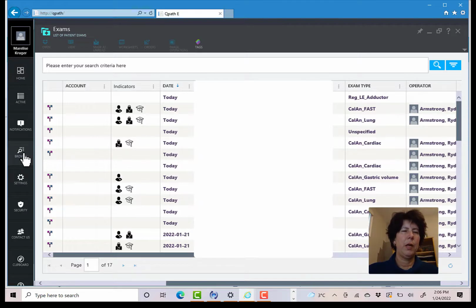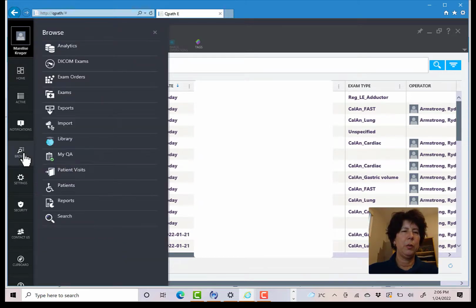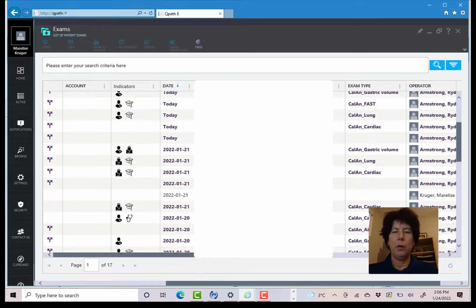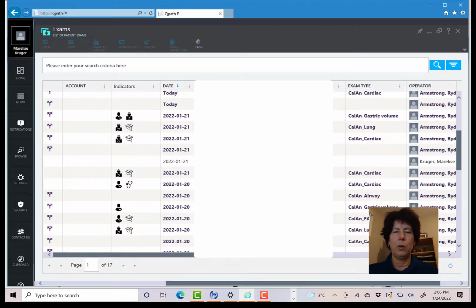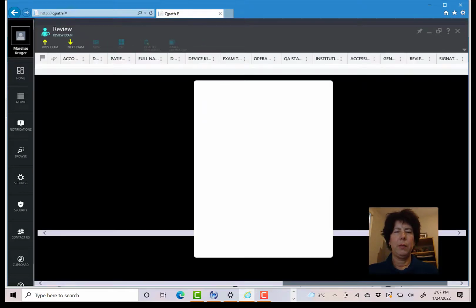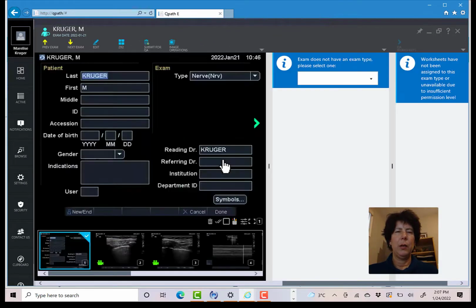If you can't find the patient sheet, you can go Browse, Exams. That will take you to the same screen. And now you will look for your patient. So I have one that I did yesterday. That's me. You click on that patient and you'll come up with this screen.